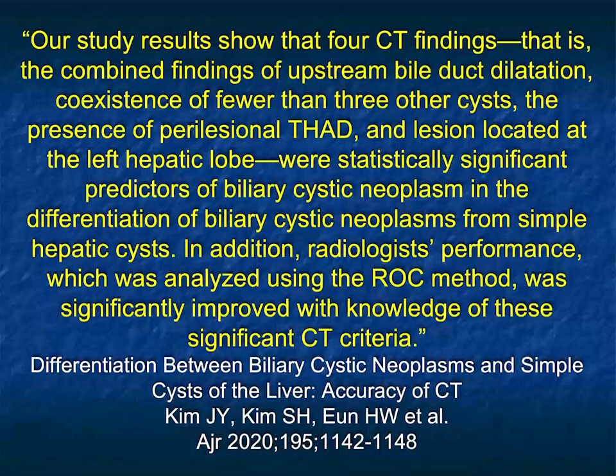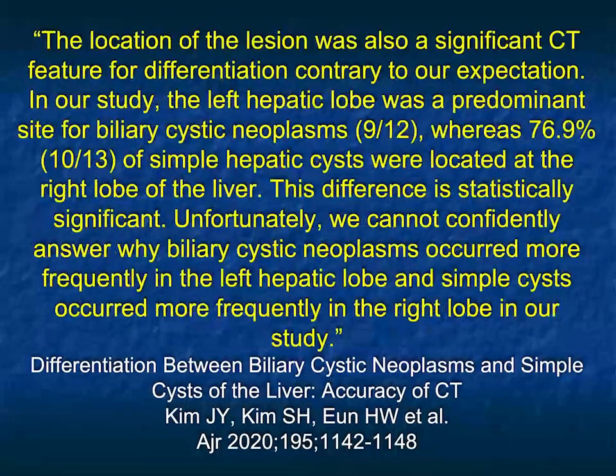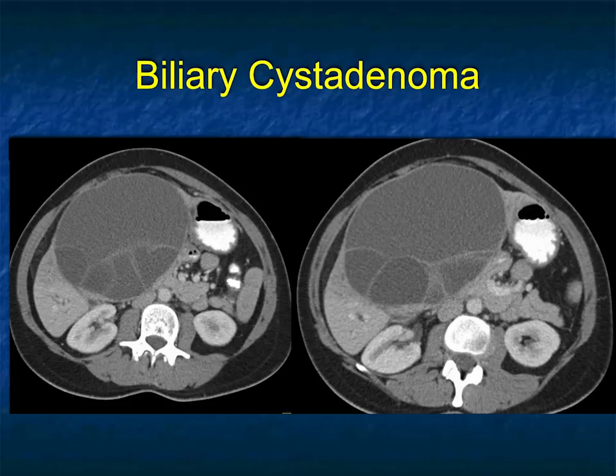You just do not see dilated intrahepatic ducts from a simple cyst even when they're large. So when you see ducts, you have to worry about malignancy. I mentioned perfusion changes are less common with cysts. They can occur, but indeed it's rare. And left lobe is more common for these biliary cystadenomas, which are like the cases I've shown you today. Hepatic cysts can be anywhere in the liver. They can be left lobe, but usually the more common right lobe, and they are in multiple locations.